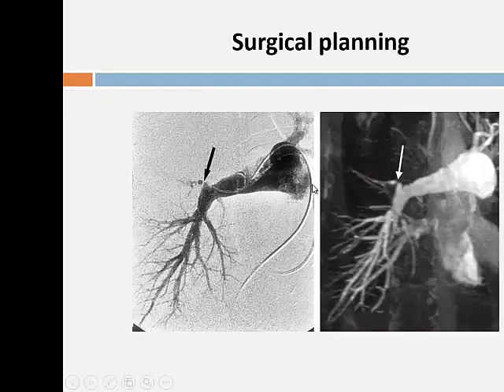So angiography, just showing you the same thing. And you can use this to help with your surgical planning. So often the surgeons want us to produce these three-dimensional MIPs, so they don't just want the axial image, they want to be able to rotate it around. You can do that nicely on MRA, because like CT, it then becomes a volume acquisition. So one of the reasons why we do MRA with gadolinium is because you can acquire your data quickly. Okay, so that means you can acquire big volumes quickly.